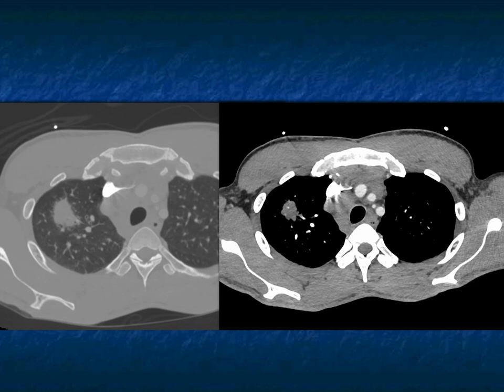This is an interesting case. There's a mass with very poor margins in the right upper lobe. This was a younger patient, let's say, low 30s. And the patient has extensive adenopathy in the right paratracheal region and in the anterior mediastinum. When you look at this, it's very easy to call this a lung cancer, and I would surely worry about this being a lung cancer and adenopathy.